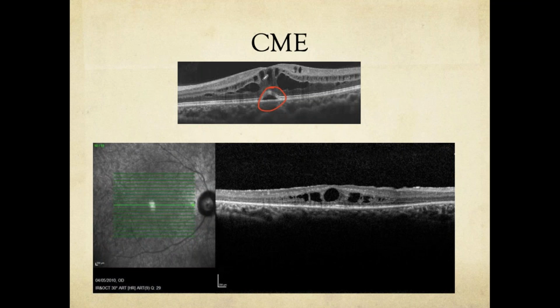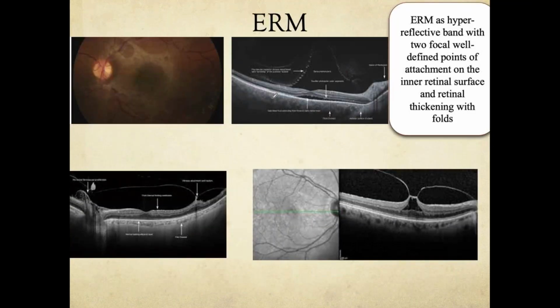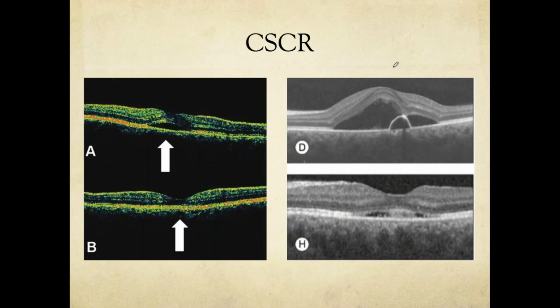Can you tell me what this is? Anyone? Is it different than what you're seeing?